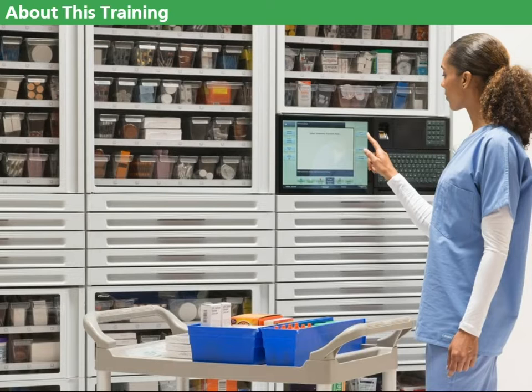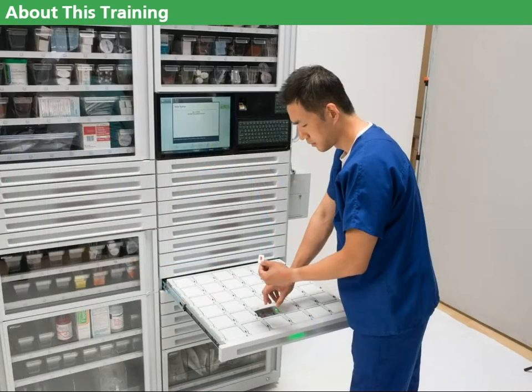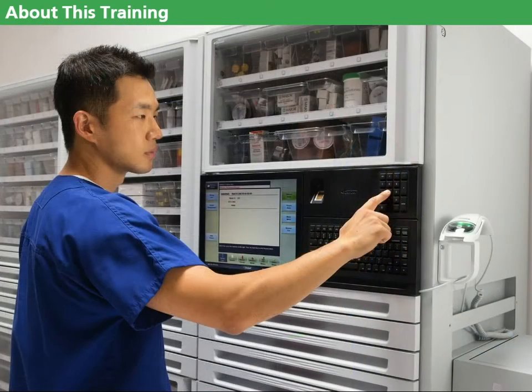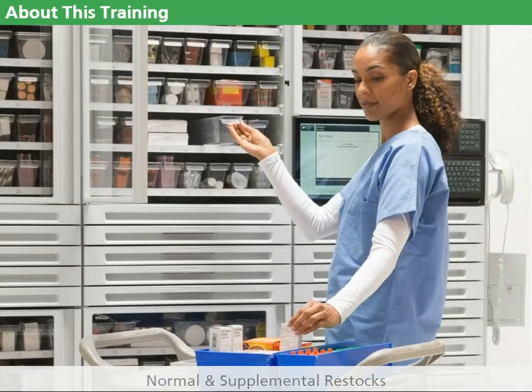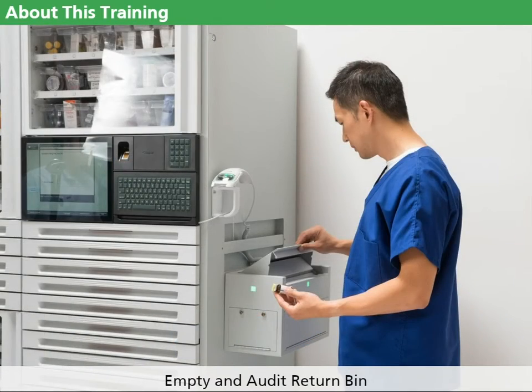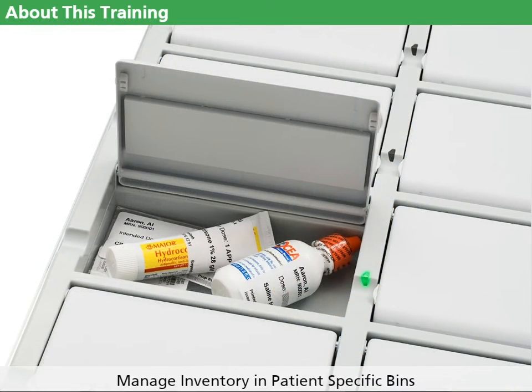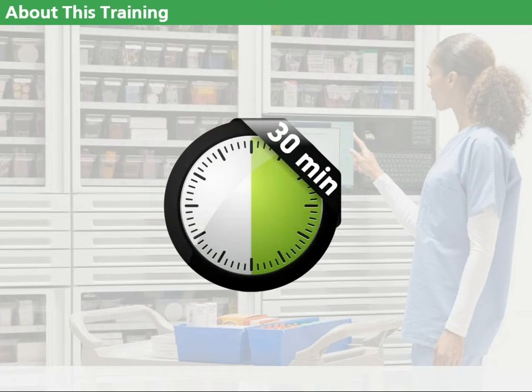In this module, you'll learn how to use ColorTouch software to manage inventory in Omnicell cabinets and remote locations. You'll find out how to perform a variety of tasks, such as complete normal and supplemental restocks, destock items, empty and audit return bin, manage inventory in patient-specific bins if applicable, modify inventory, and more. This course will take you approximately 30 minutes to complete.